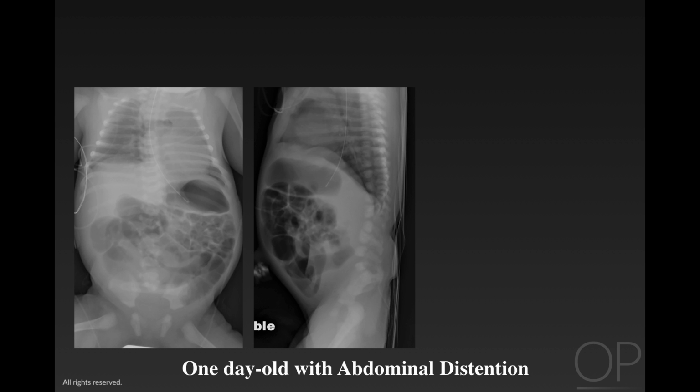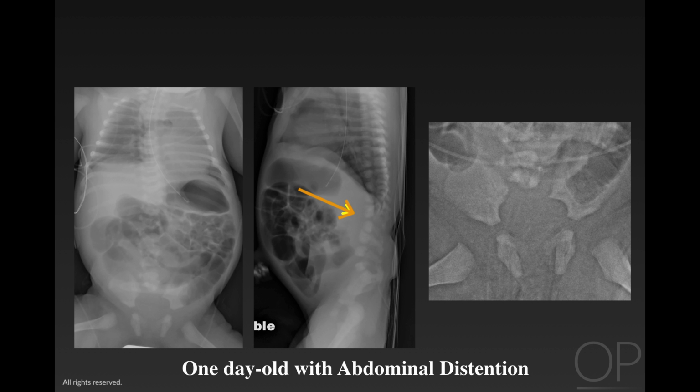Here is another baby with abdominal distension who has a nonspecific pattern of distended bowel, but in this situation the bony findings give us a clue as to the diagnosis. We see multiple segmentation abnormalities of the spine, and looking at the pelvis we see an absence of the sacrum in a baby who has the VACTERL anomaly and sacral agenesis.